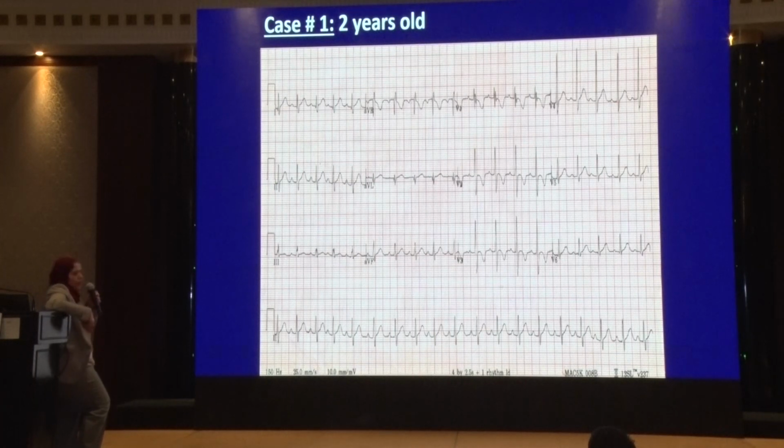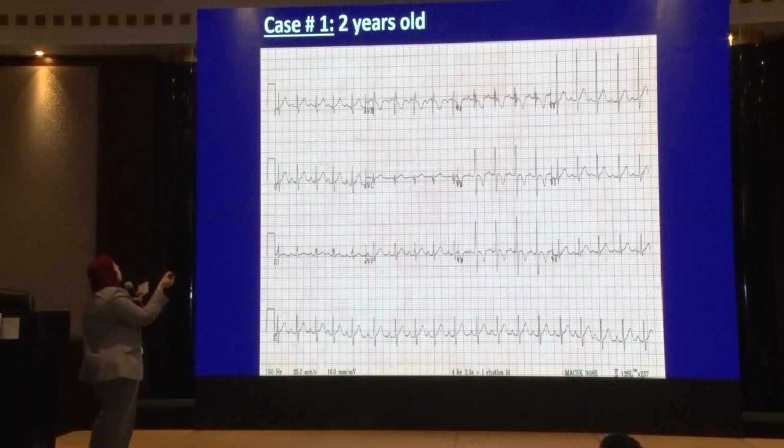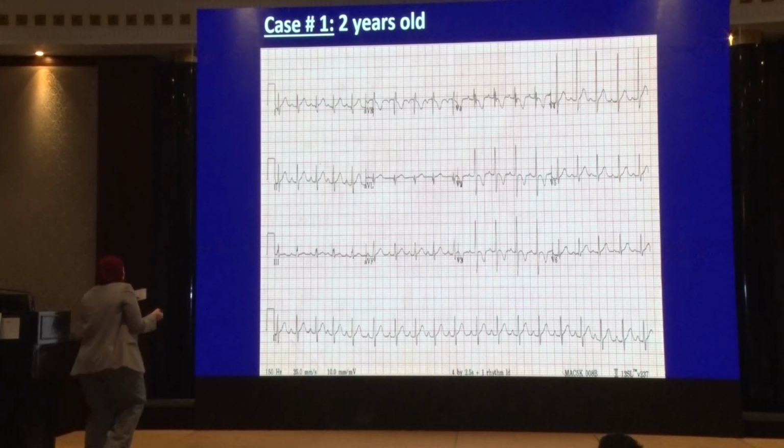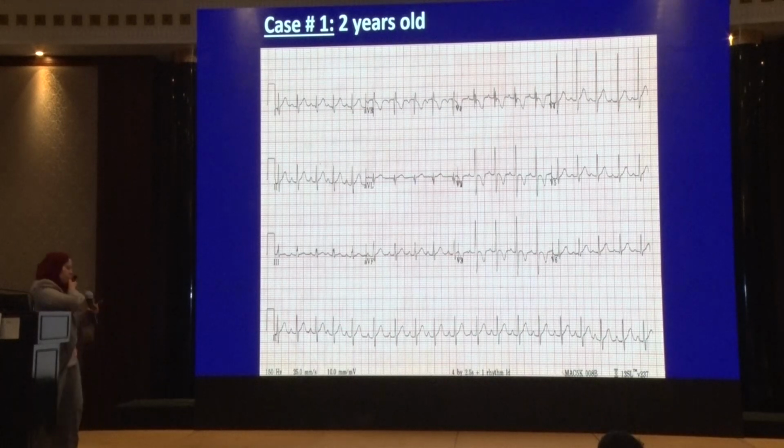What are we going to look for in the chest leads? Yeah. QRS duration, is it more than 2 small squares? No. Yeah, no. And the RS, the R dash, is it taller than 10 millimeter? No, so this is normal. Then what do we have? The ST segment. Is it on the same level as the PR segment or a little bit elevated but less than 2 millimeter? Yeah. In the chest leads, is it on the same level as the PR interval? Is it isoelectric?